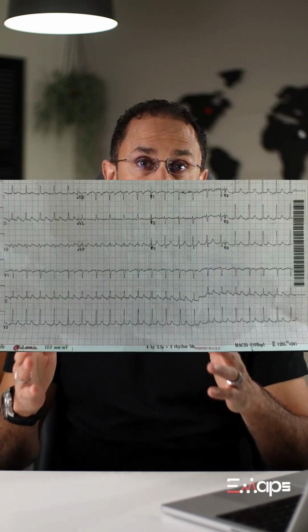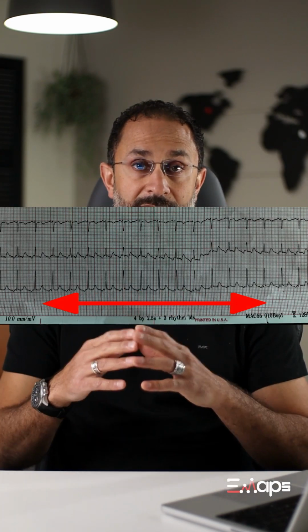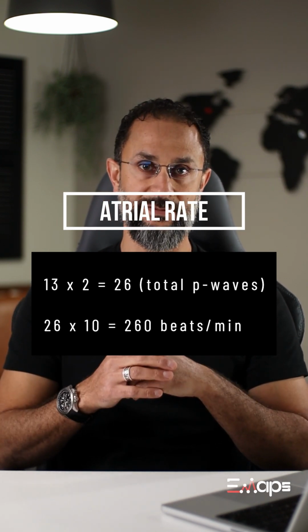And if we count the number of P waves over the period of 6 seconds, you will see that they are 13. Now, because we already know in advance that there is another P wave that precedes the P wave that you're able to see on the EKG, multiply that number by 2, that gives you 26. Times 10, that's 260 beats per minute. This is your atrial rate. In a 2-to-1 AV conduction, you divide 260 by 2 gives you a ventricular rate of 130 beats per minute, which exactly matches the ventricular rate of the patient clinically as well.